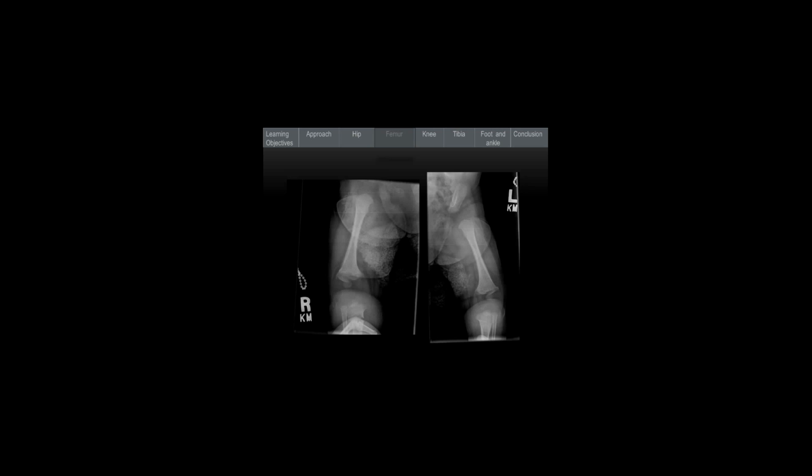We're going to stay with the femur for a little bit. There are some subtle findings on these radiographs. I hope that through the internet and through the shared meeting online you're able to see them, but I'll point them out. These findings are some of the most important findings that we can make, can really be a life-changing finding in any child's life.